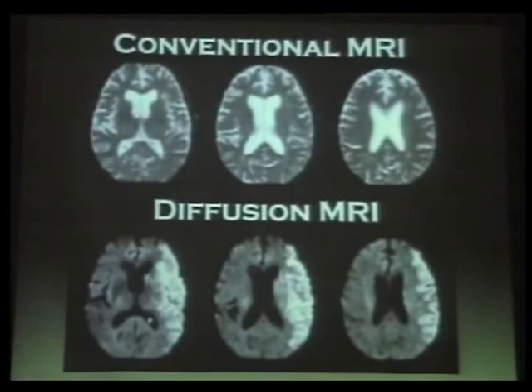And the reason it's important is conventional structural T2 MR might show nothing. So this person's hemiparetic and aphasic. There's no signal abnormality on the T2, and yet the diffusion-weighted imaging shows that they've got a hyperacute infarct in progress. Every year I see 2 patients referred to me with a normal MR, even though they are having a stroke, because the diffusion wasn't good enough, or they just used the conventional MR only and no DWI was performed.